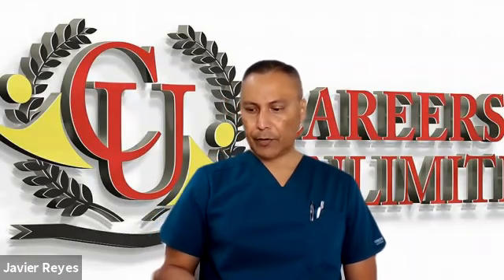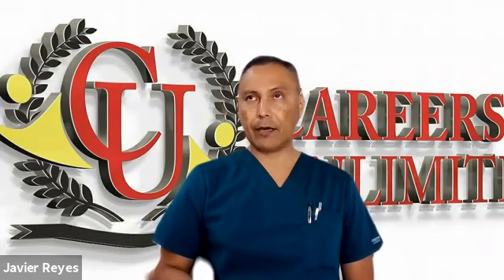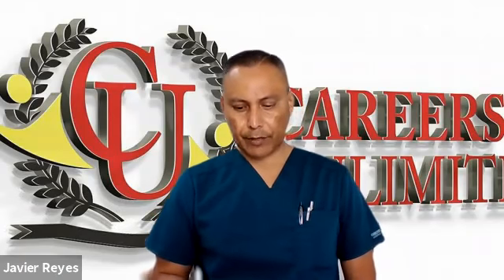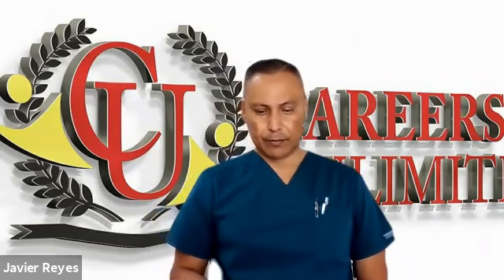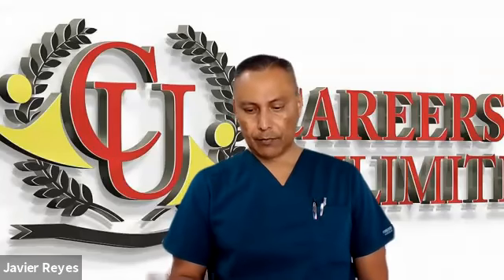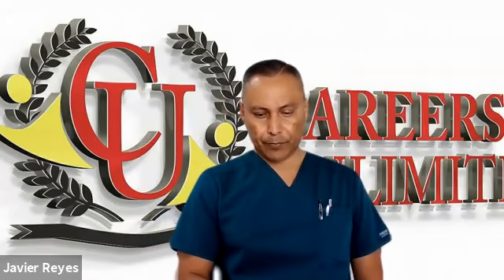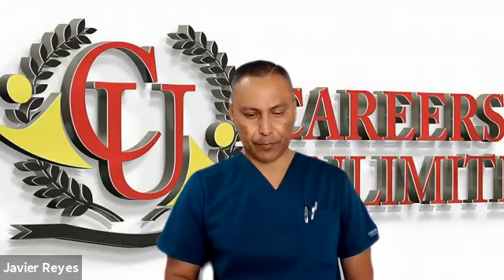Okay, let's just quickly look at a couple of them here, like number 22. Remember, you've got to list all the criteria. Is the rhythm regular? Get your calipers and measure, or I like to use 2 fingers. It looks pretty regular. I would say regular rhythm. What is the rate? If it's regular, you can use any method. You can use the 6-second method. I would probably say it's 50. Are the P waves present? Yes, they're pointing up. Looks like a sinus rhythm.